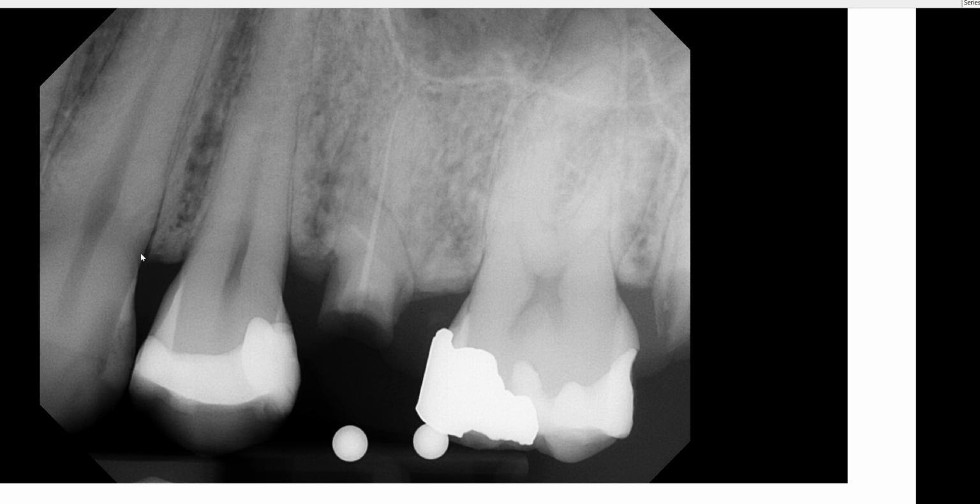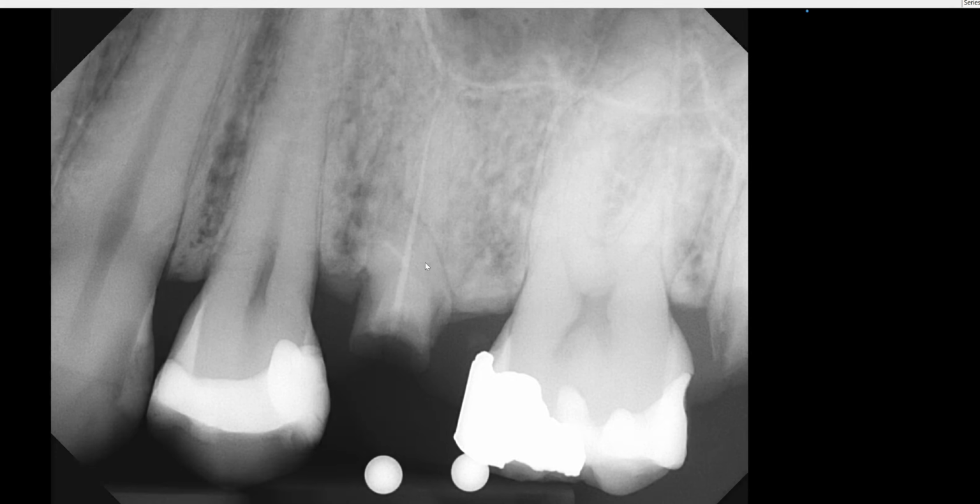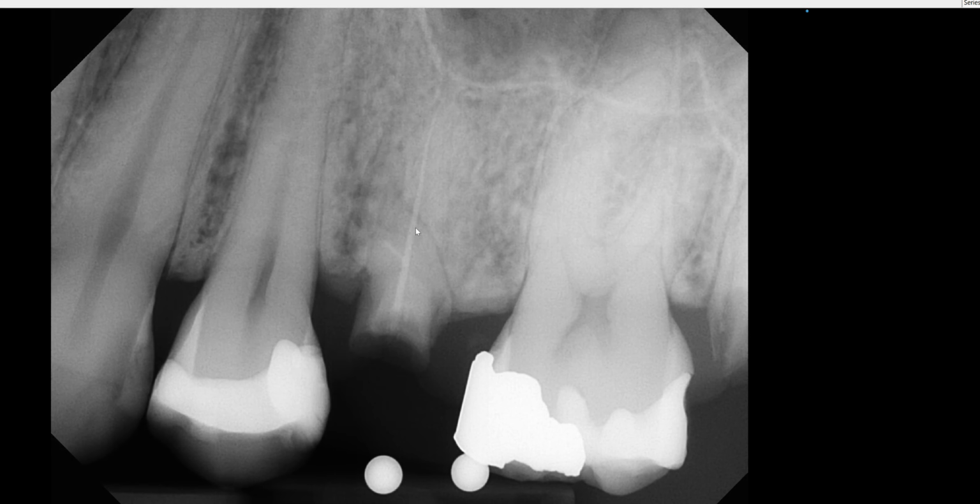As you can see, we have 11, here's 12, 13 is shown here with largely missing its crown, and we have tooth number 14. So yes, the crown of number 13 is missing, and you can tell that this root has endodontic filling material along the canal, and possibly there may be dilaceration of the roots with lateral canals or a canal that's going into the second roots possibly.